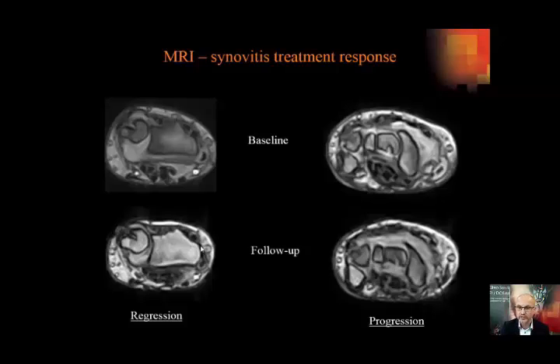than when the disease activity is treated, where the volume will then be reduced, as in the case here to the left, baseline and 4 weeks after the injection of a steroid. We see a definite change in both the bone structure but also in the synovial volume.